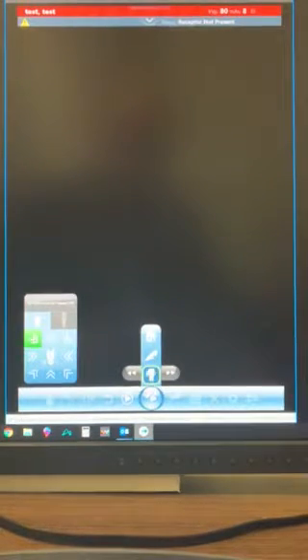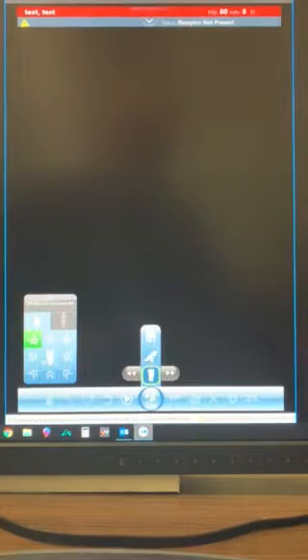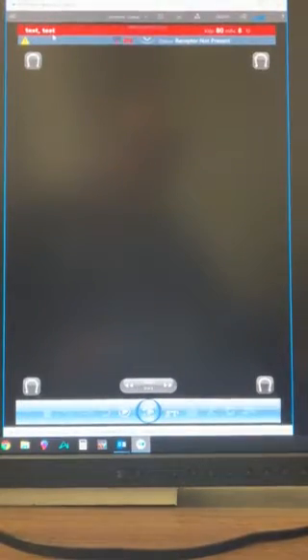And you'll notice that currently the tooth icon is the one that is actually highlighted. If they want to switch to the other detector, they may go ahead and hit the lateral view of the foot radiograph icon here. They will notice that another exam has been set up and it says test at the top here, meaning it's the same patient has been created but using for the digital radiography modality.